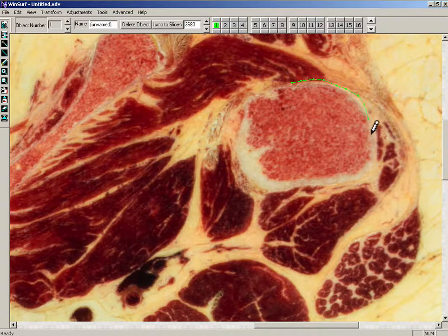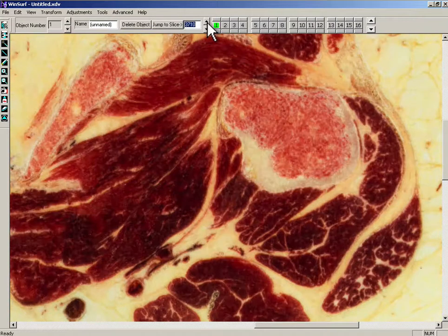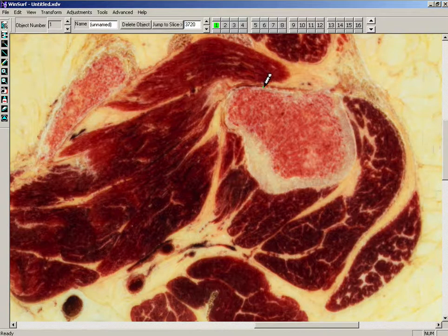Now we are reaching the small trochanter here, a little bit lower. Here, you see the beginning of the small trochanter. I continue my drawing with the cortical bone. It could be done very quickly, but if you make a mistake, it's very easy to correct.